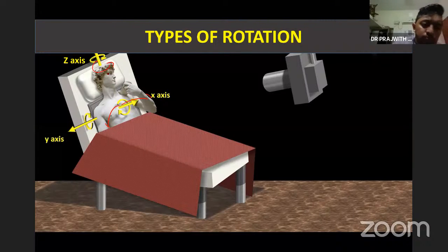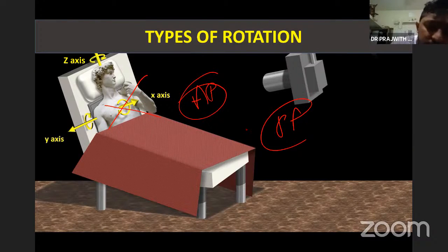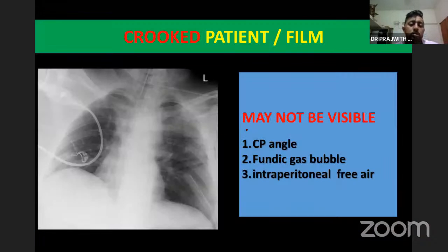the central axis. So whenever this rotation happens, the right and left rotation won't happen much. So usually we don't bother much about AP because AP is very bad images. But in PA film, we always see these things because PA gives a very good picture, and that's why we bother to see in that. So the right to left rotation, all that can be clearly seen.